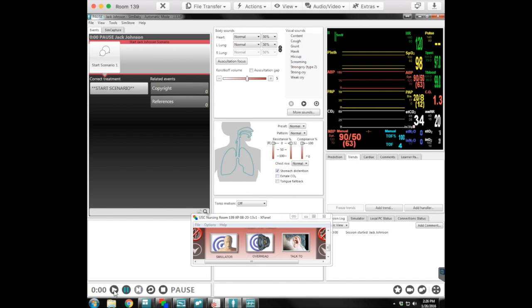Let's go ahead and hit play. That does not start the scenario. All that does is wake the mannequin up. So your students are ready. You hear the knock, and then start the scenario.